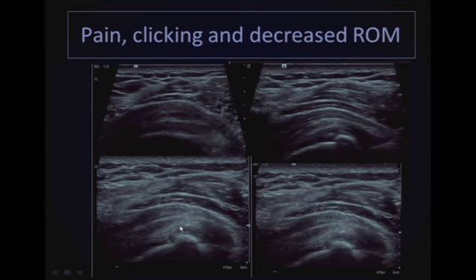But if you look a little more closely at these 2 images, just blowing up these images, you see that there is an extra layer here, which is this. This should not be counted along with the supraspinatus tendon. This is actually the subacromial subdeltoid bursa. But in this case, it is not distended with fluid. It is just thickened. So this is chronic thickening of the subacromial subdeltoid bursa in the setting of possibly a chronic bursitis.